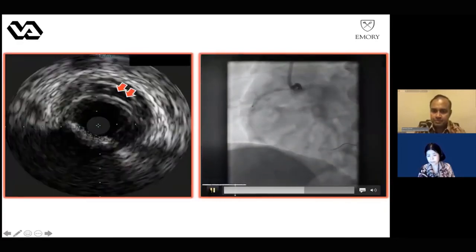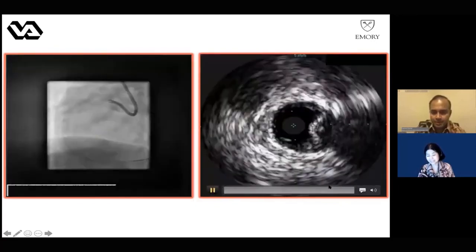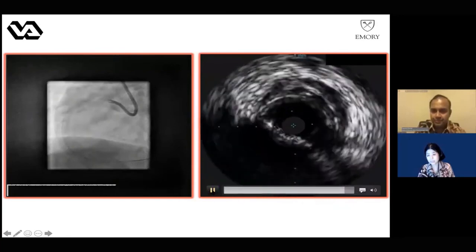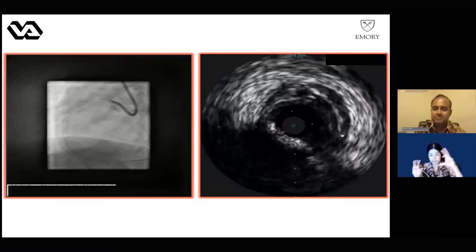You see the 3 o'clock, and then jumping proximal to the stent. Oh, I'm sorry. Let me see if I can get it back. Okay, here you go. So this is exactly the edge of the stent. And now you see, let's say start, yeah, that's the place. You see again the dark area. This is really outside of the intima, meaning that it should be either inside the media or probably media or adventitia, some of those spaces making the intramural hematoma, which I showed in my presentation.